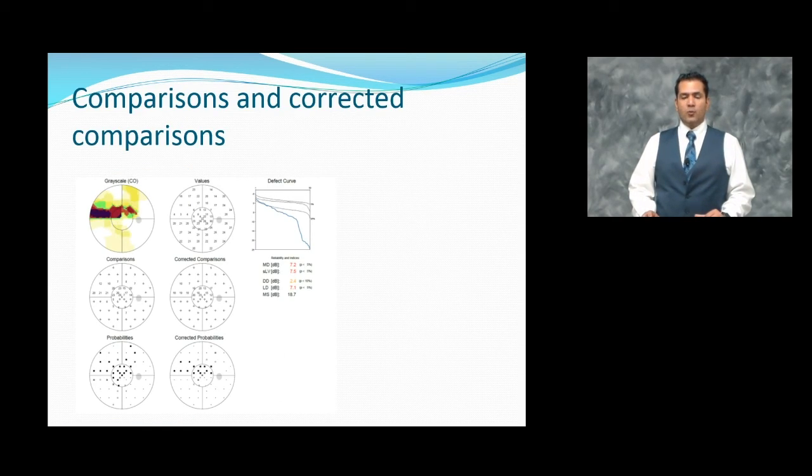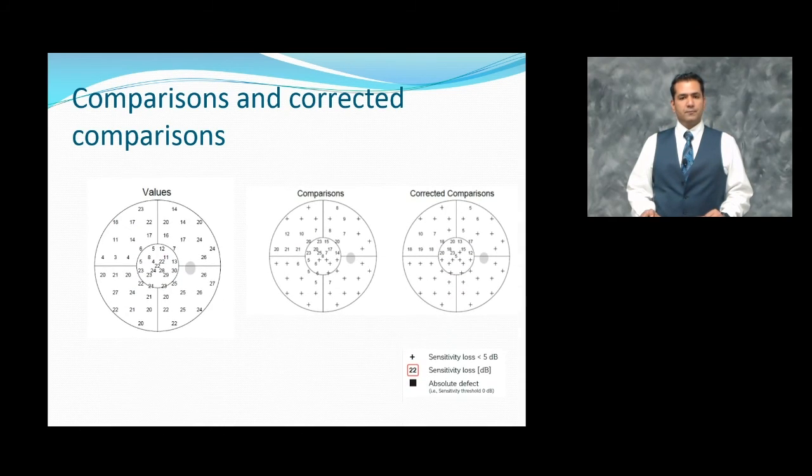From the grayscale, we go into the comparisons and the corrected comparisons. So here you have the raw data of the patient that is compared to the patient's age-matched controls, and you get the comparisons plot. When you see a plus sign, that means that the sensitivity loss for that patient is less than 5 decibels, which is acceptable within the ranges of fluctuation. Whereas if a number is represented, that essentially means that there is a significant loss recorded compared to the age-matched control.